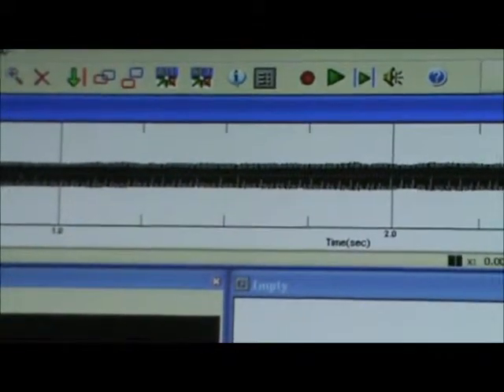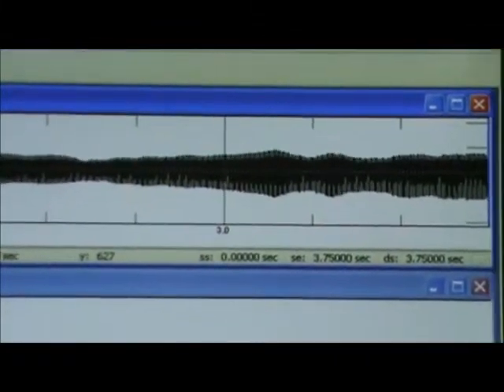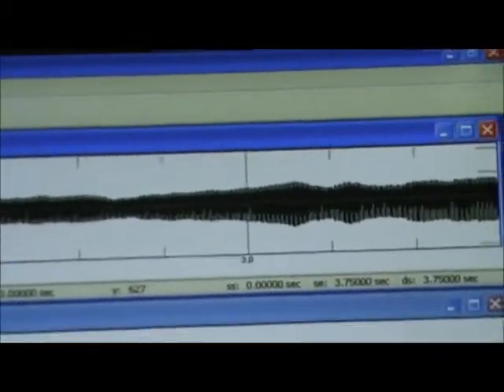Now there's a couple things to consider. One is you want the sample that's actually a little bit skinny. It's not too bad, but you really want it to be a little bit fatter, closer to that, so that it takes up a good portion of that little screen. If you get too much in there, you'll see a red, and I'll demonstrate that, and then you have to redo the sample, and I'll show you how you deal with that.